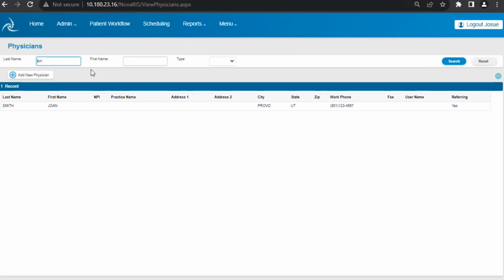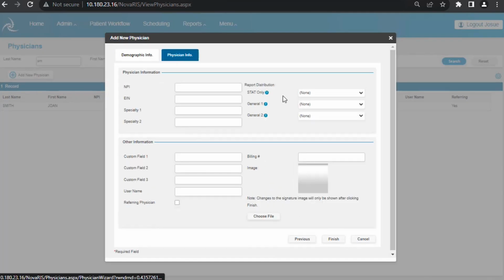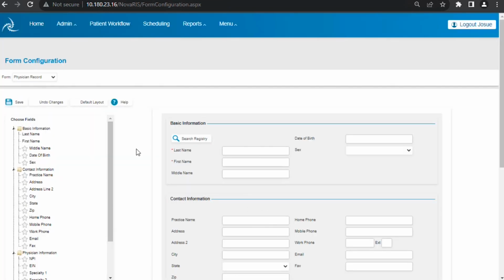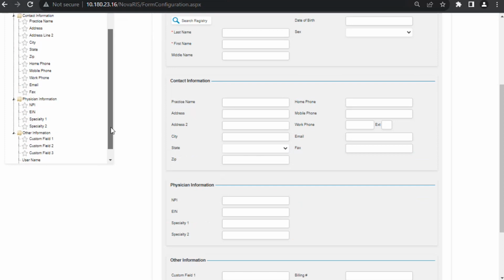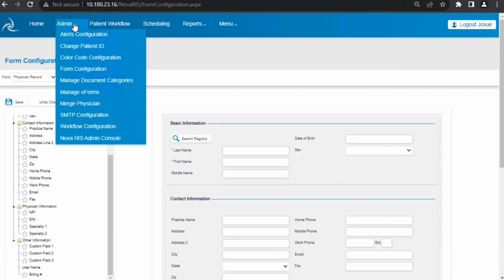So that form that you will see when you are creating a doctor, and you also will have all their license and all your site information, this form is exactly this one where you can change. So as you can see here, it will let you also do the same. You cannot hide that information, but you can mark it required or change the order of the information if you require it. So that is for our tool for using our forms configuration.